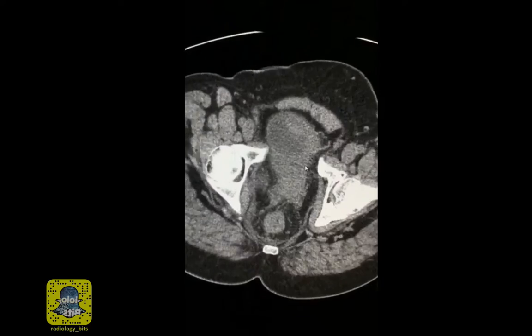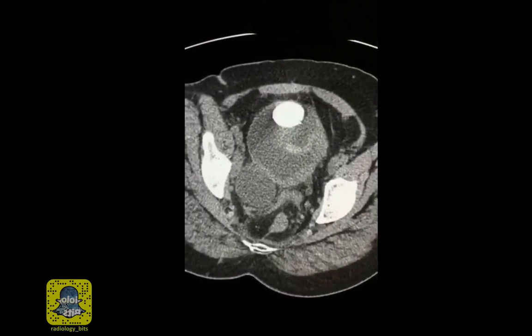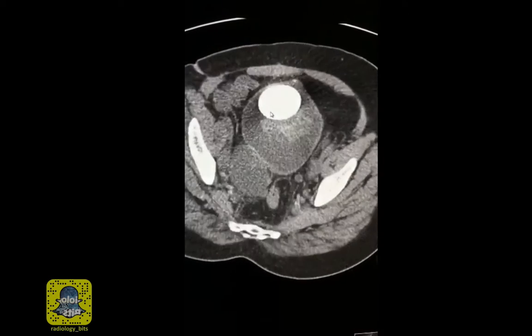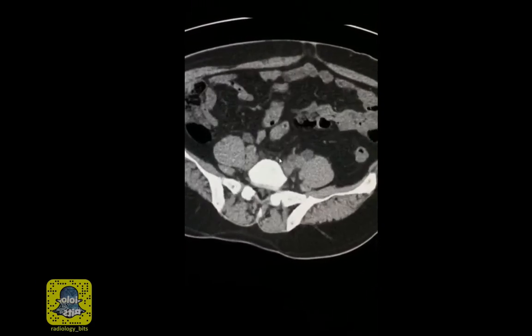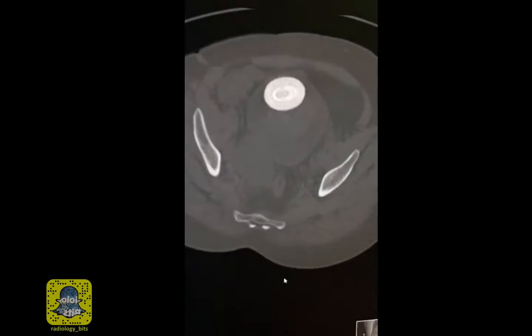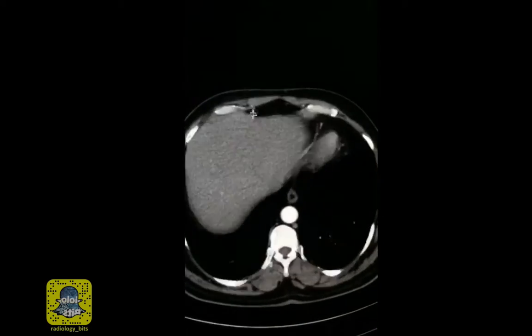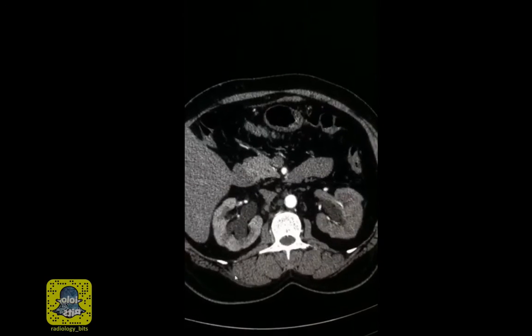We saw also multiple features of obstructive uropathy in the form of dilatation of the urinary bladder, a diverticulum, an internal stone, and back pressure effect leading to dilatation of the ureters and renal pelvis. We also learned that stones may have a lamellated appearance, and we discussed the utility of viewing the scan with contrast and doing that at multiple phases.